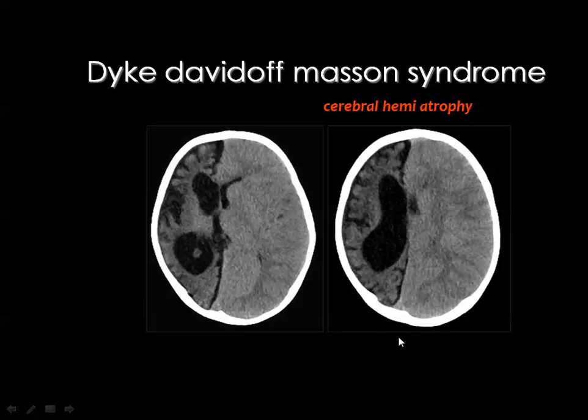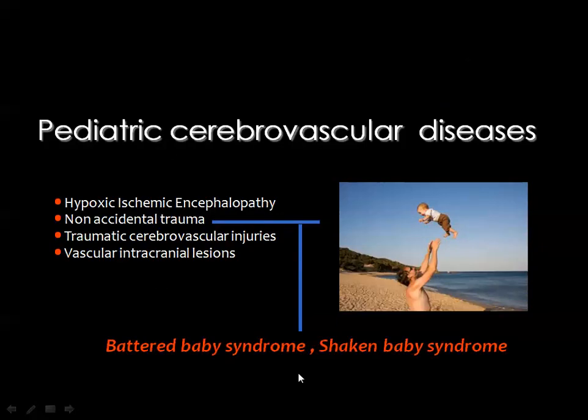In this cerebral hemiatrophy, you will see, number one, eccentric position of the falx cerebri, dilatation of the ventricle in the atrophic hemisphere, as well as dilatation of the cortical sulci, sylvian fissure, and all the extraaxial CSF spaces. There may be some parenchymal areas of encephalomalacia as well, compared to the normal sized hemisphere.